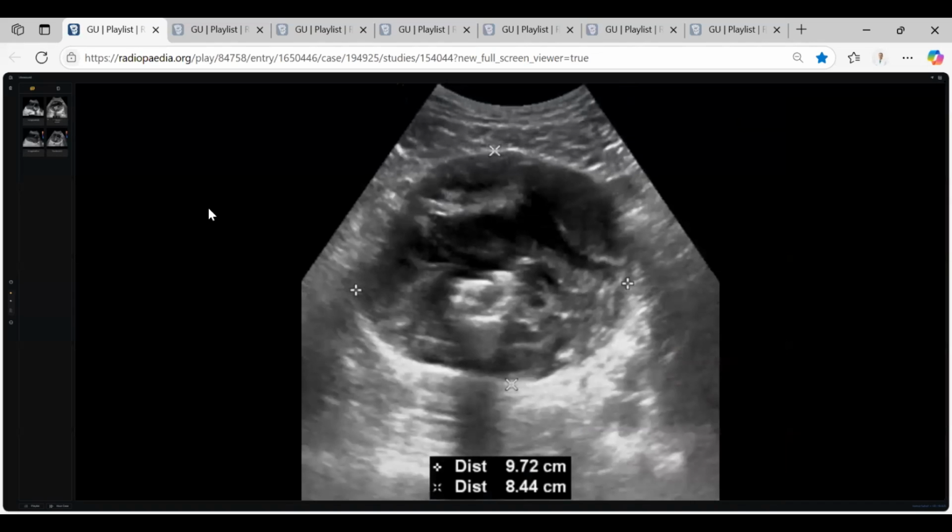What will you do next? Sir, I will delineate it. First I will locate where the lesion is. Second, I will see its compressive effect over the adjacent structures. It may cause complications like hydronephrosis. The next step should be to advise interventional radiology to aspirate it and check the content of the lesion. But I also want to see the complications.